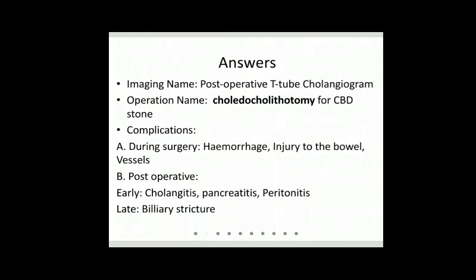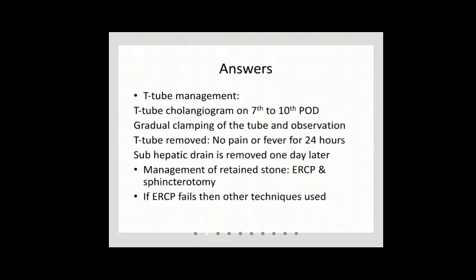So next important is what is the management of T-tube? After putting T-tube, after choledochotomy, you have to manage T-tube this way.